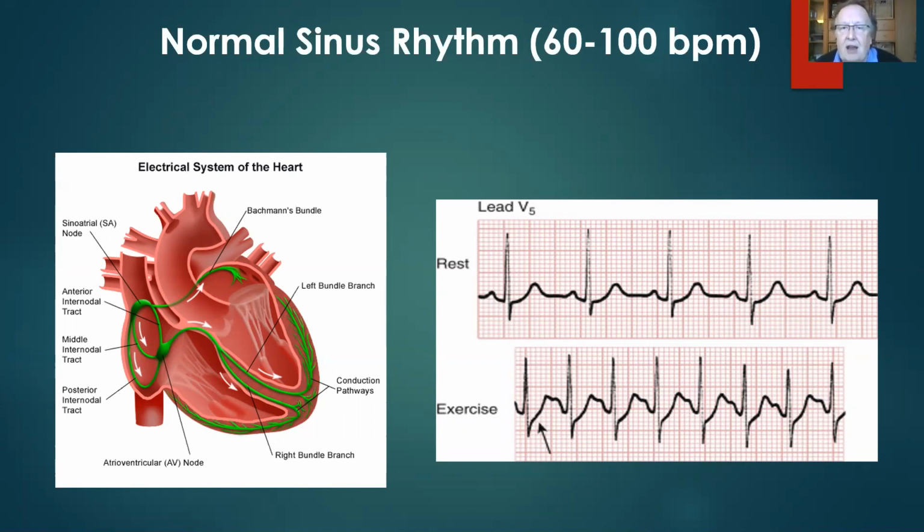And is the T wave the right way up and greater than the P waves? Because obviously P waves are little muscle mass, ventricles are bigger muscle mass. And we look at rest there and we can say, yes, I'm quite happy with that ECG.